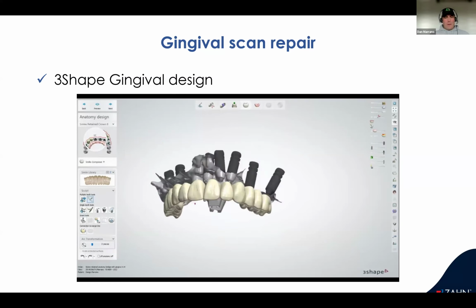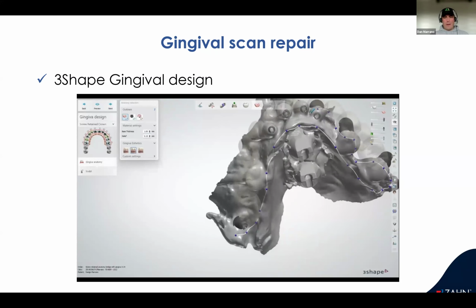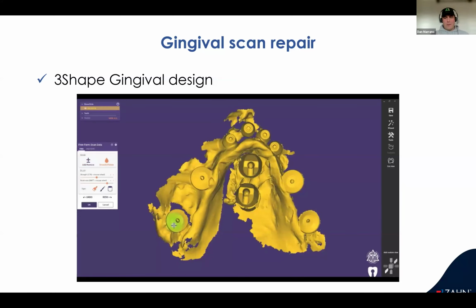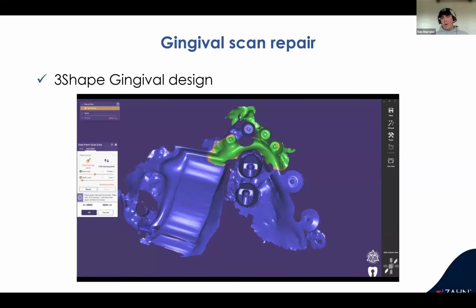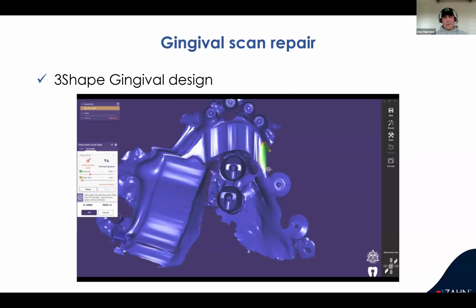Then we get to there's our design. We get to the tissue and carefully trace this around so we're not in any holes or anything like that, and it still airs out. So what do we do? I'm going to bring this into exocad, and I quickly realize how many holes are in this. So I'm not even going to bother trying to fill these holes. I just create myself a nice, clean canvas.